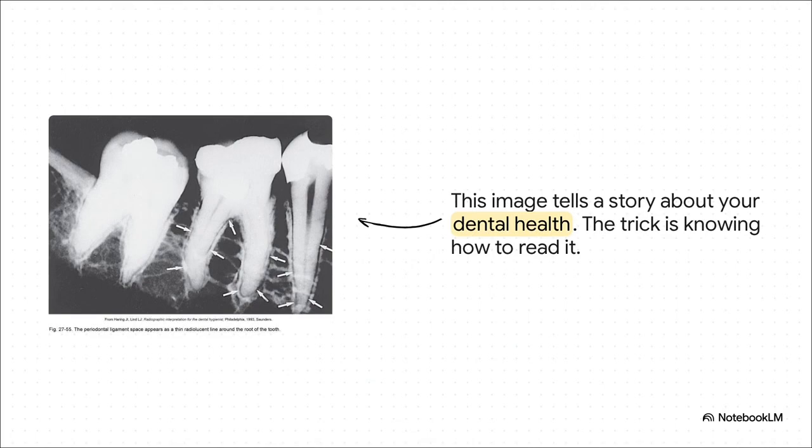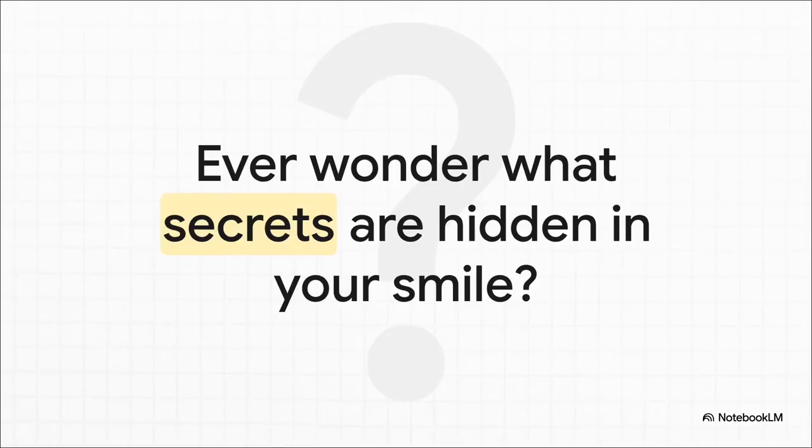So here it is. This is the mystery we're setting out to solve. I know, it might just look like a jumble of shadows and bright spots, but believe me, every single part of this image tells a story about your dental health. The trick, of course, is just knowing how to read it. So think of this as a kind of detective journey. We're about to uncover all the secrets that are hiding in plain sight right there in your dental X-ray.